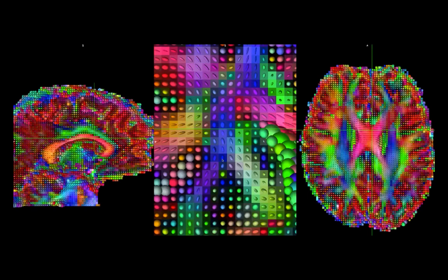A couple of the other ones are the corona radiata. It's primarily blue because it goes up and down. And I check either the superior longitudinal fasciculus or the cingulum bundle, right above the corpus callosum, which primarily goes from back to front. If those check out, probably it did a pretty good job throughout the whole brain of fitting the tensors. That's my approach. Other people may disagree. Some people prefer to look at each orientation volume separately to make sure that it looked at the orientation that it was supposed to. I consider that a bit of overkill, but again, people may disagree with me.